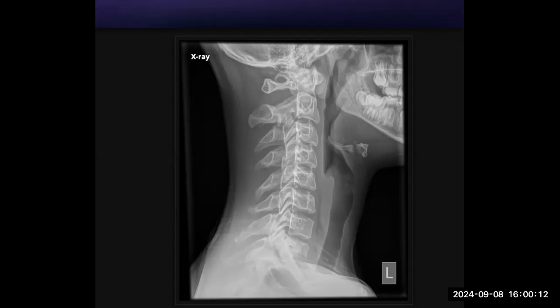I'm going through my checklist again. I'm looking at the overall oropharyngeal airways. Okay, that is normal. And there seems to be an opacity in the upper esophageal airway, just below the hyoid bone. Suspicious for a foreign body which has stuck there, which might be the cause. Other than that, the prevertebral soft tissues appear normal. There is no widening there, and the facet joints appear normal.